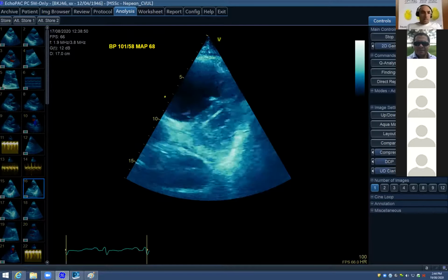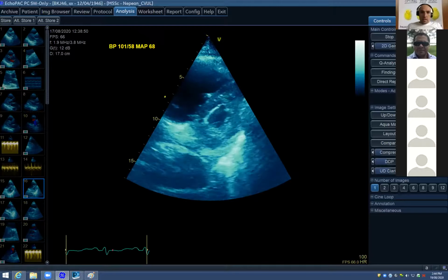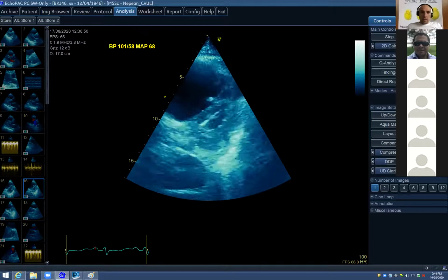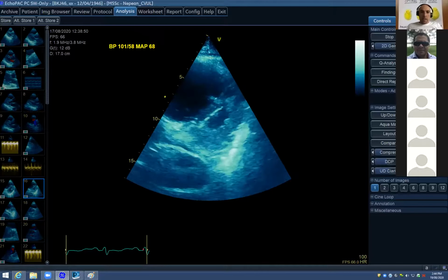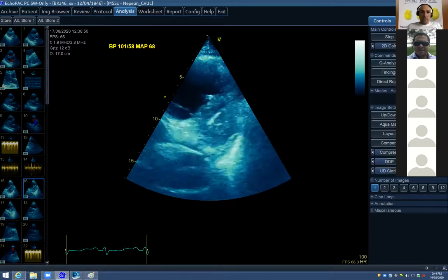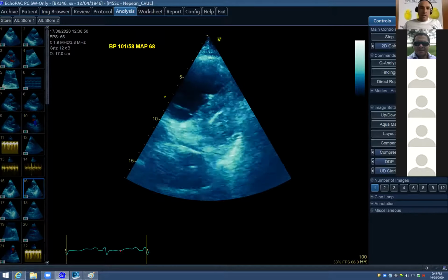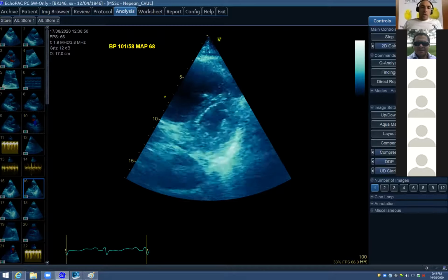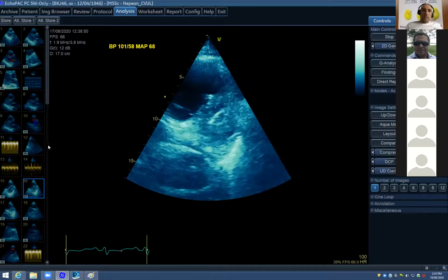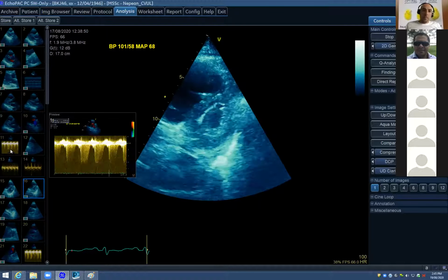Yeah, so cardiac timing wise, it looks like a pressure and volume overloaded RV now, I think. I'd normally slow that down and just look at it, but it looks like it's essentially a D-shaped septum throughout the cardiac cycle. Very nice. The size is obviously dramatically increased. Yeah, so it's now absolutely severely elevated.